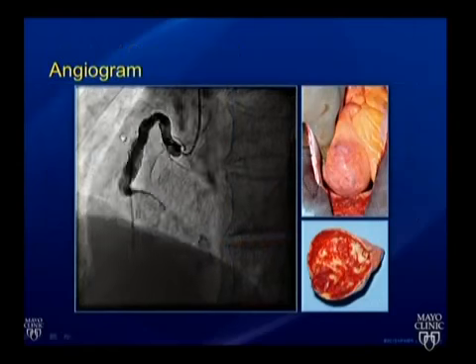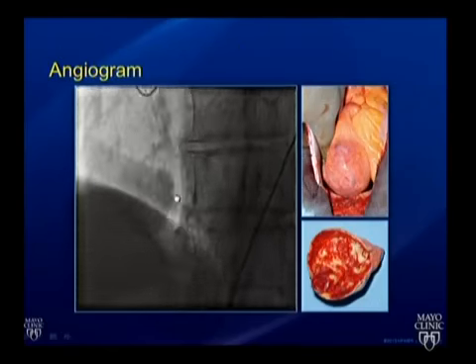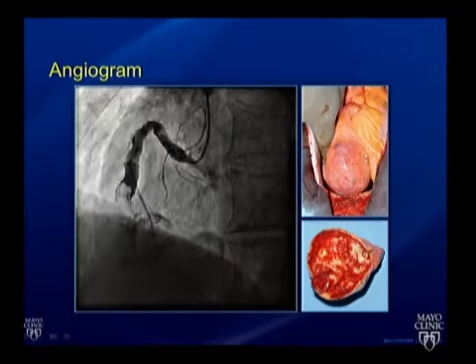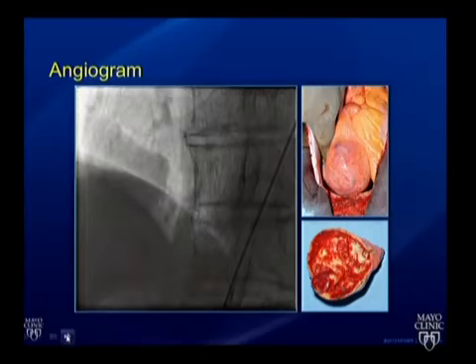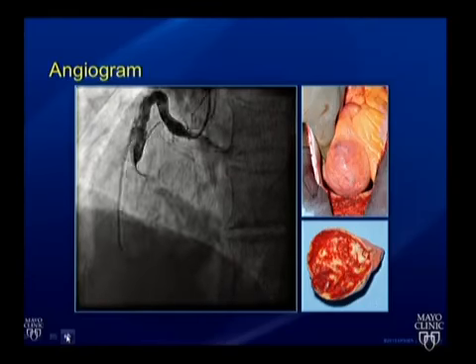That one was a chamber, you could also give contrast in this situation. Of course, we're giving it by cath now, but this is a very large cyst, or aneurysm, you can see it, giant coronary artery aneurysm. So that's something else that can be in the AV groove. Again, you couldn't necessarily make the entire diagnosis in the echo lab. You could consider it and give contrast, and if you have arterial contrast in there, you will see that there's an arterial structure.